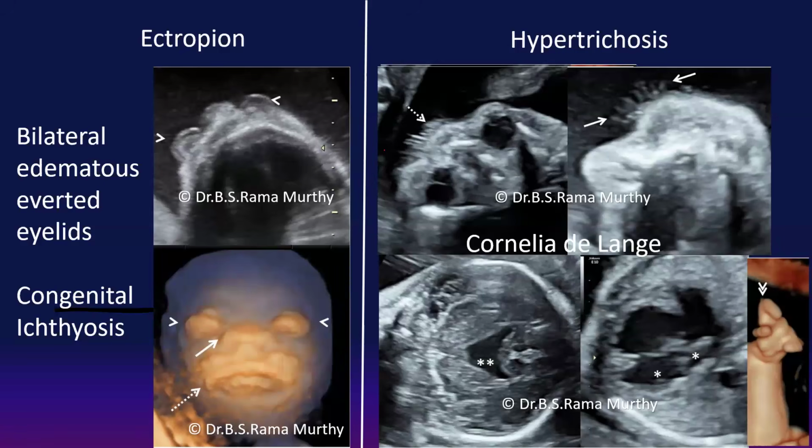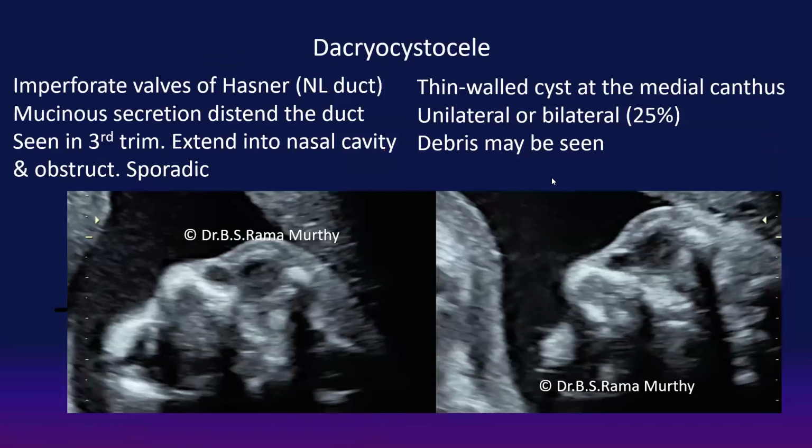So all of these cases I have borrowed from Dr. Ramurthy's collection, of course, and these are extremely rare cases. So I don't think we must all expect to see them in our practices, but it's nice to know how much ultrasound can show us. And if you put the entire picture together, we get our answers.